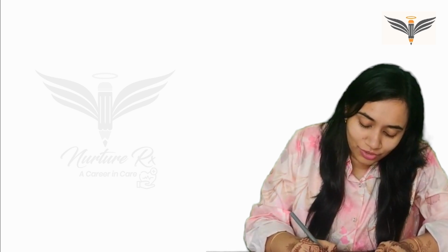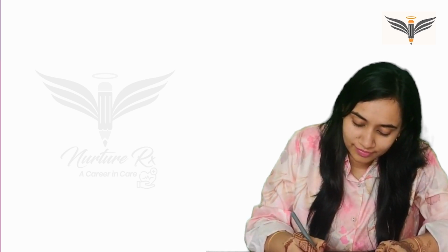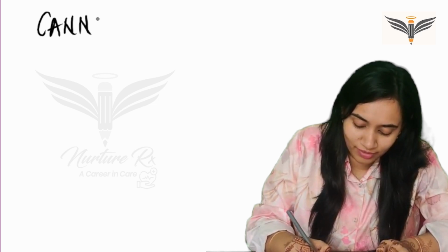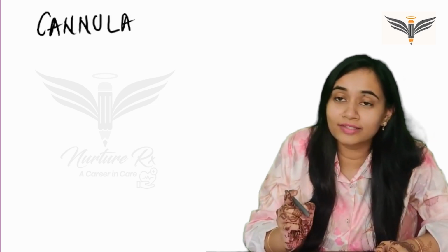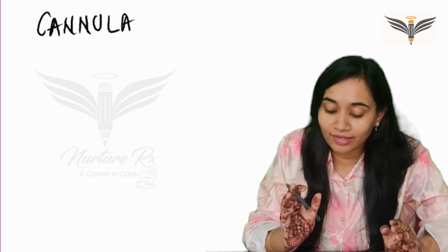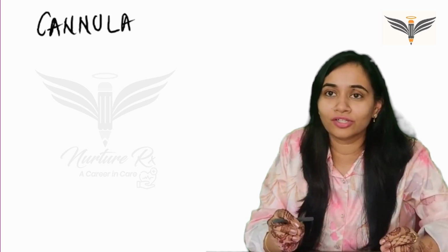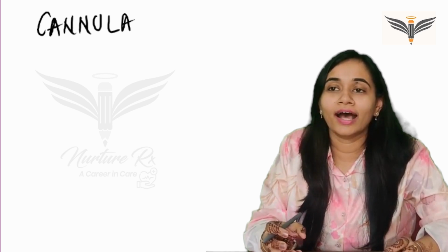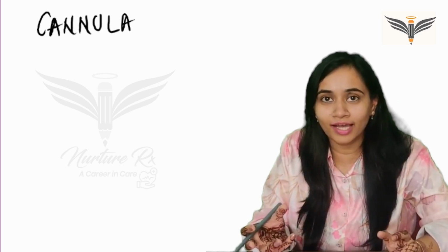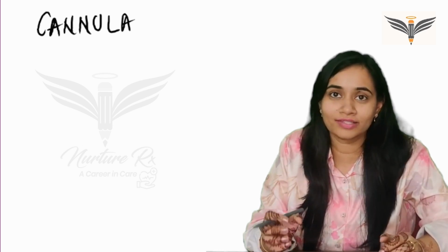Hello friends, today's topic of discussion is cannula and its parts. So, why is cannula important for us? Cannula is important both for practical reasons and for your exam purpose. You have to insert a cannula somewhere or the other wherever you are posted, and from an examination point of view it is important to know what is a cannula and what are its various parts.